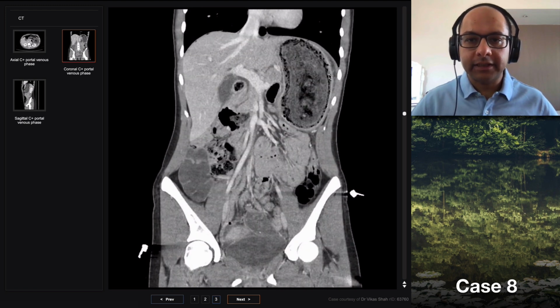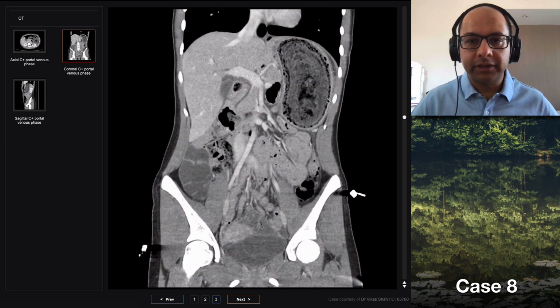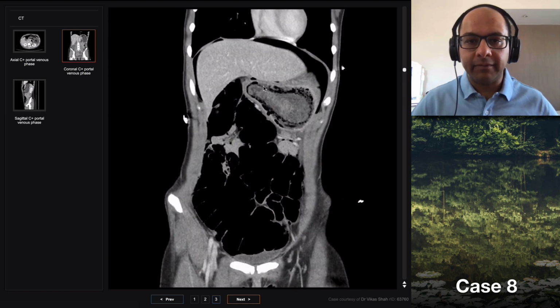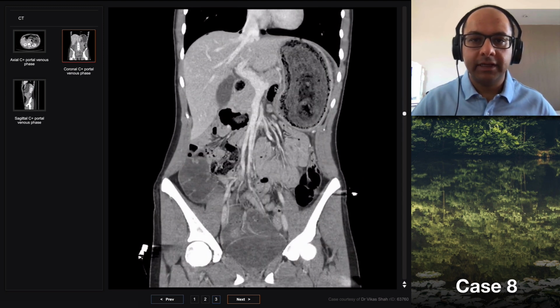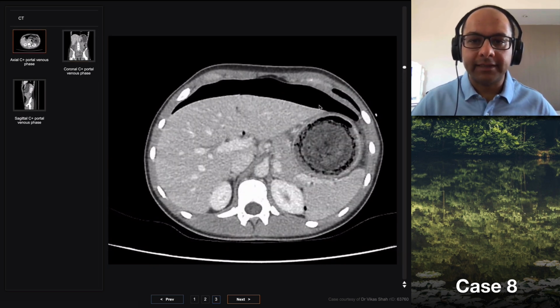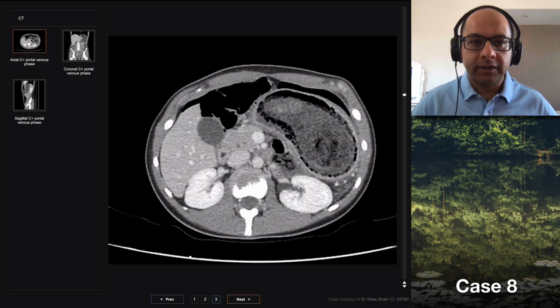It's very distended. I think this looks like it's gas within the wall, but I suspect it's trapped just deep to the wall. It is inflamed. I think the cause of the perforation here is stomach wall ulceration, and it's the stomach that's perforated. And as you said, there's a very large pneumoperitoneum, so all of this is free gas within the abdomen. Does anyone know what's going on in the stomach here? Bezoar? Yeah, what type of bezoar?